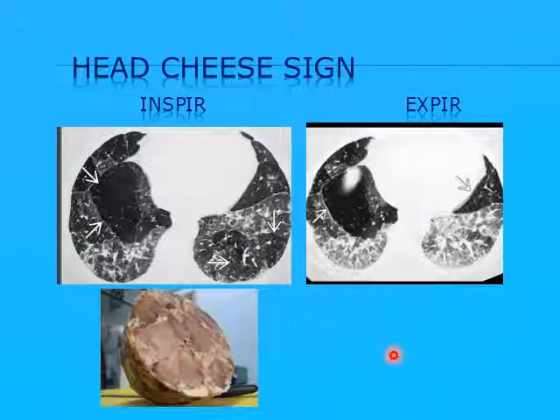In a history of chronic exposure to certain allergen, you can diagnose chronic hypersensitivity pneumonitis. The magic word in chronic hypersensitivity pneumonitis is the presence of areas of air trapping in addition to ground glass opacities, because we will see similar pictures but without air trapping in other diseases such as non-specific interstitial pneumonitis.